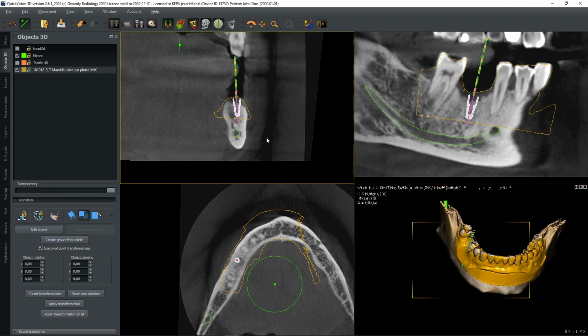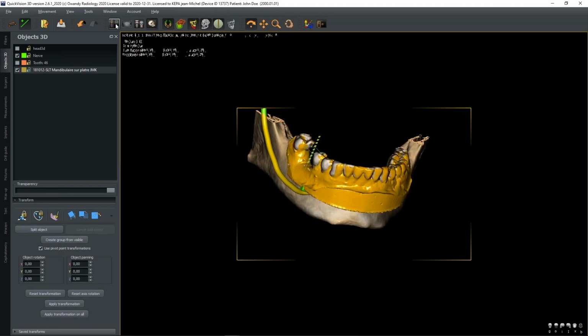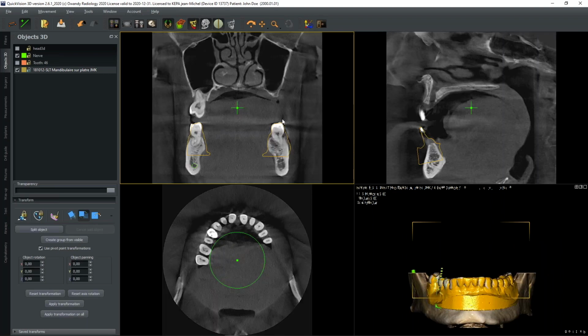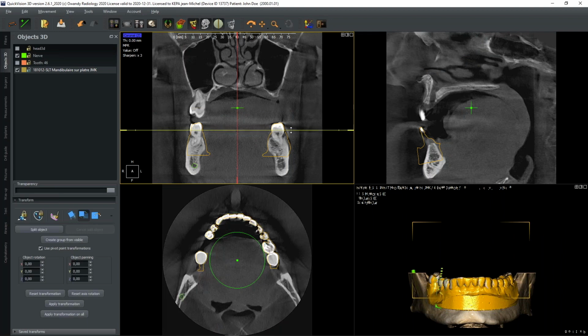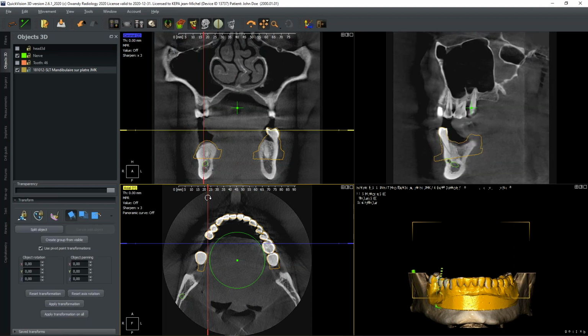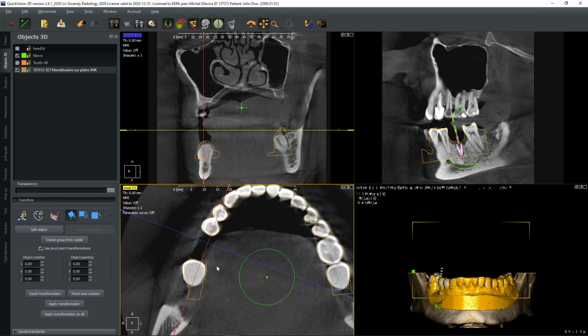You may also see the profile of the object, which means you may realign or readjust the position a little bit if desired. Reset the position, call back my axis, I go to that area here, the desired area where I will create a surgical guide. And now I see, oh, maybe I have to realign the position a very little, my object, like we did with the crown.